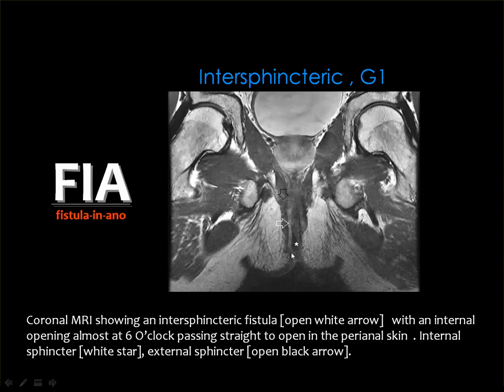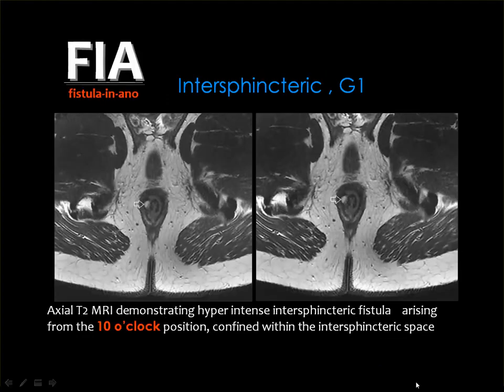also in the same track. And this is the internal sphincter, and this is the external sphincter, and you consider this as an intersphincteric fistula.